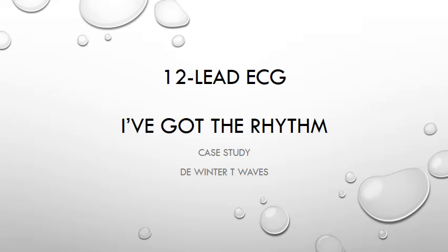In this episode we will be looking at some case studies that have been previously posted to the group and using them to discuss and explore De Winter's T waves.